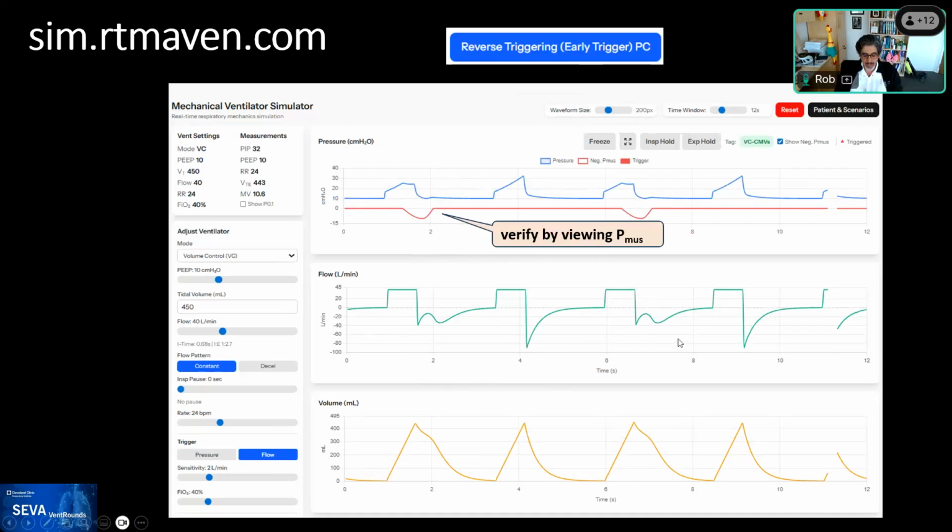Yeah, and the reason for that is in volume control, the distortion is in the pressure waveform, but in pressure control, the distortion is in the flow and volume. And the expiratory time is all pressure control. So in fact, the ventilator is doing volume control for inspiration and pressure control for expiration. And that's why your eyes go here and here. Also, there are trigger flags, but there aren't any patient-triggered breaths, so there's no flag showing up.